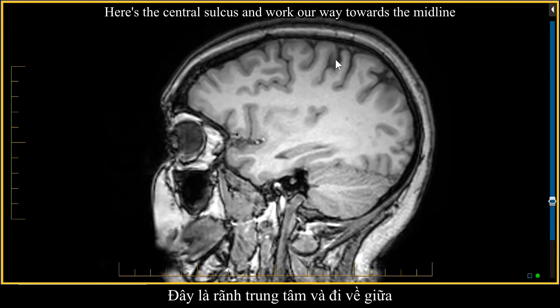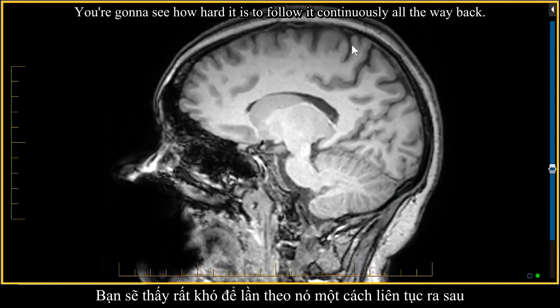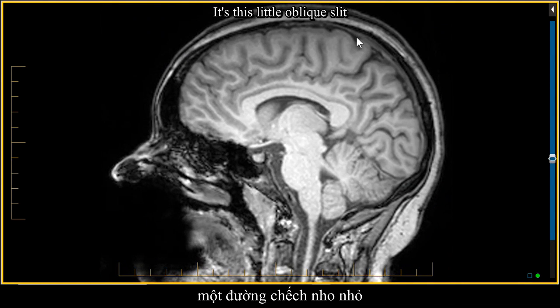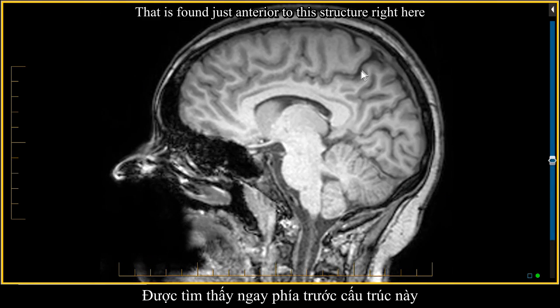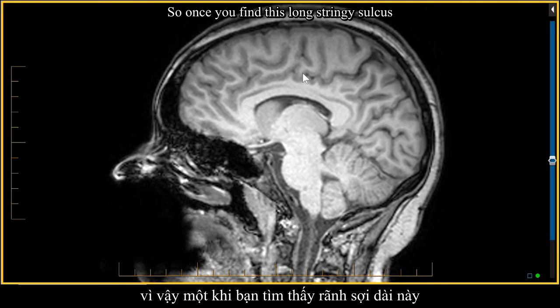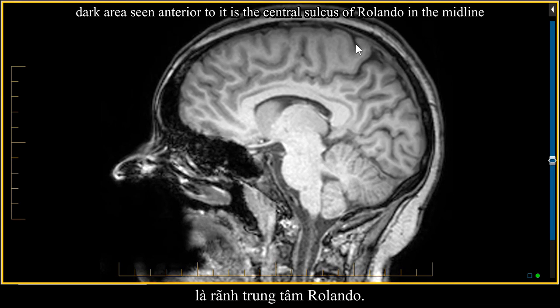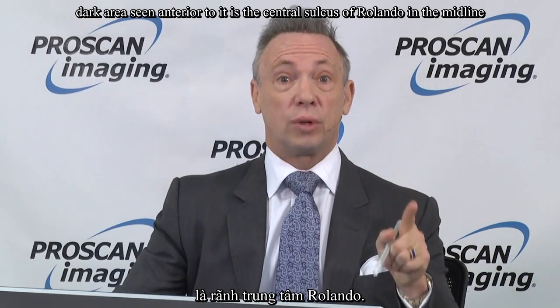Now let's go back to the central sulcus for a minute. Here it is. Here's the central sulcus, and work our way towards the midline. You're going to see how hard it is to follow it continuously all the way back. We're still following it, and we've got it. It's this little oblique slit that is found just anterior to this structure right here, which is composed of the cingulate sulcus and the supramarginal or marginal sulcus right here. So once you find this long, stringy sulcus that goes into the cingulum, right in front of that, the oblique, dark area seen anterior to it is the central sulcus of Rolando in the midline.